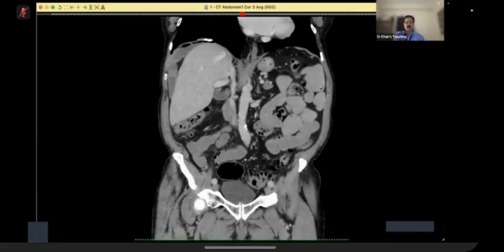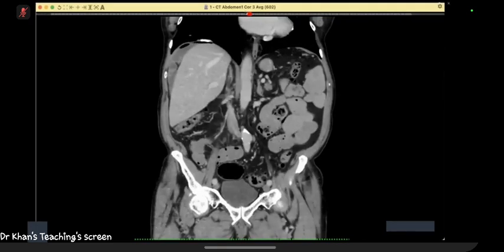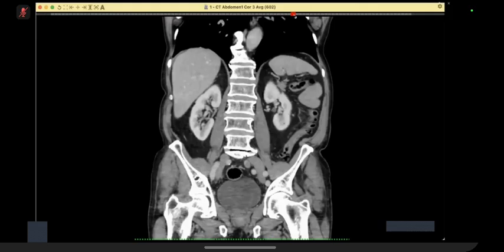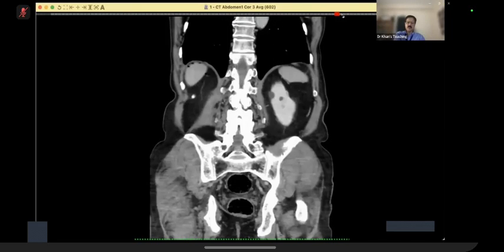I've given you a coronal. So I'm presented with coronal images of the lower chest, abdomen and pelvis in the portal venous phase. So in conclusion, you can scroll. Just look at the large and small bowel, and consolidate your findings and then tell me what is happening.